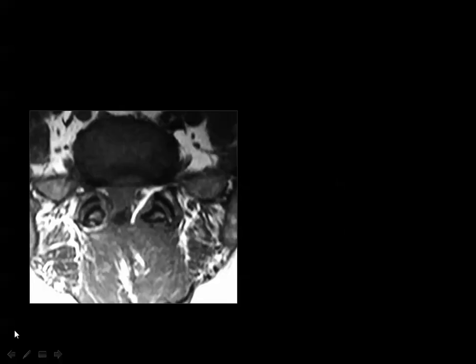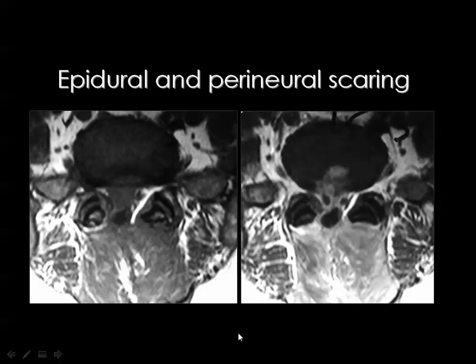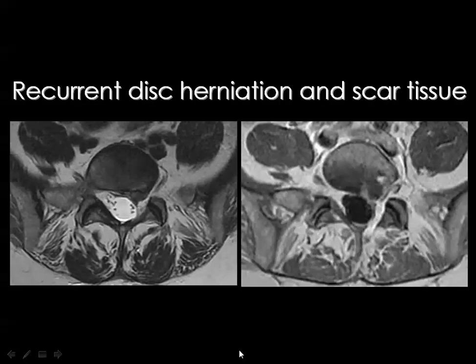In this case, you see this is spinal laminectomy, and there is a big defect in the posterior aspect of the spinal canal, and this is the thecal sac, and you see a big shadow here. Then you inject contrast medium, and you can see easily that this shadow represents a postoperative scar, and there are two nerve roots, and this is the thecal sac, which is decompressed at the laminectomy defect.